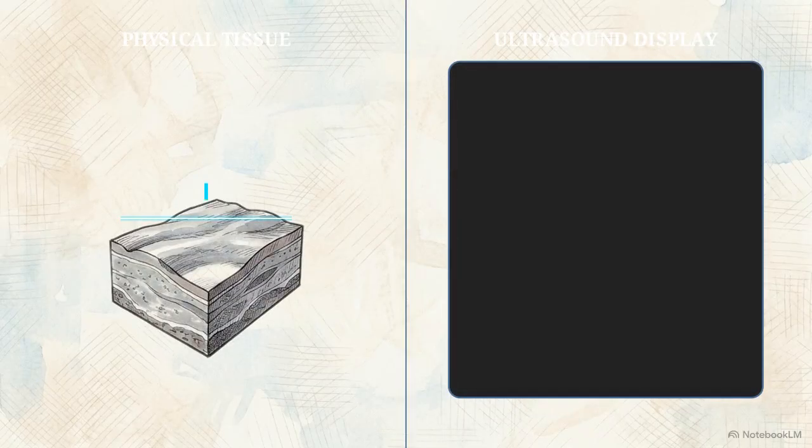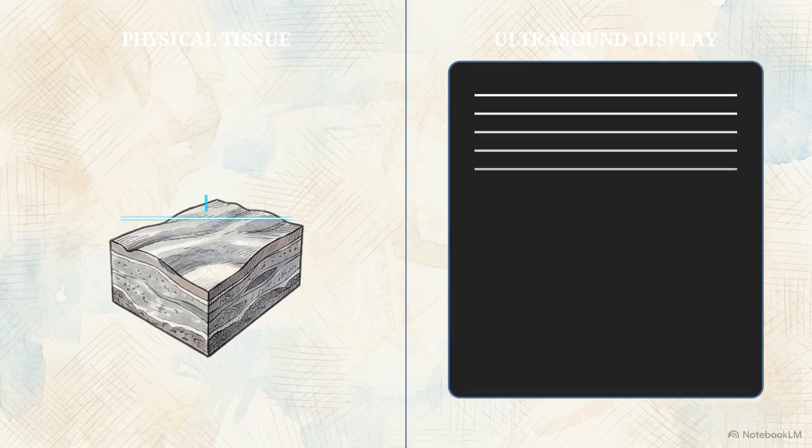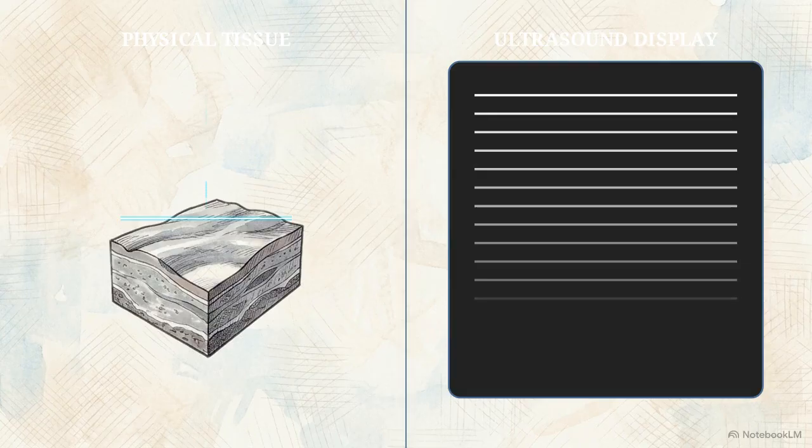A sound wave gets trapped, bouncing rapidly back and forth between the transducer and the shallow reflective interface. Each successive bounce sheds a weaker echo, returning to the machine a fraction of a second later. Assuming every echo is a single reflection, the software interprets these delayed arrival times as signals from progressively deeper structures. For every delayed bounce, it plots a horizontal stripe, creating a ladder-like pattern plunging deep into the image.